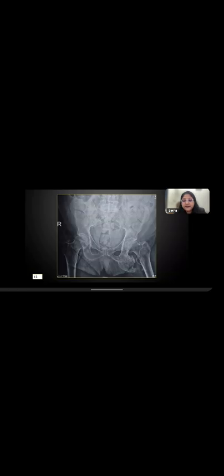You have to write 13 and write, okay? I've told you, you have to write 13 and write, okay? Yeah, myositis ossificans, no, no. Okay, yes, 13: osteochondroma of the left inferior pubic ramus.